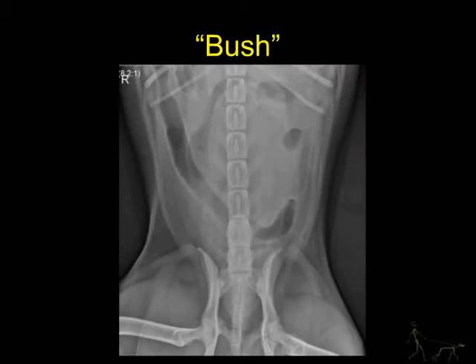In the caudal abdomen, again, numerous small bowel loops are present. There is also a lack of feces within the colon, which typically lies to the left of midline. Close inspection of this region of the colon to the right of midline shows either an abnormal opacity within a small bowel loop or possibly feces. However, again, this is on the wrong side of the animal.